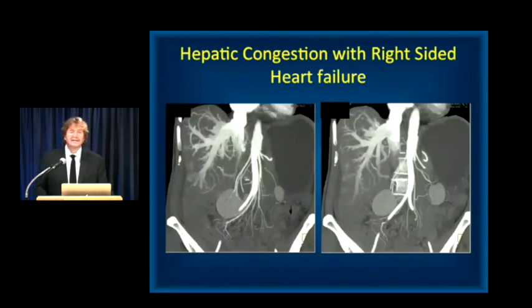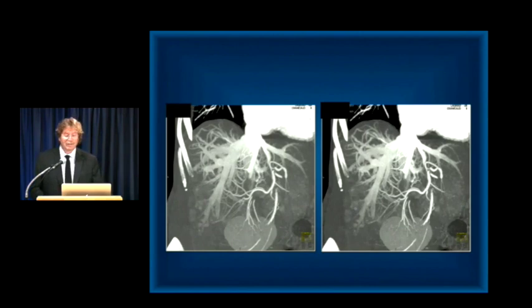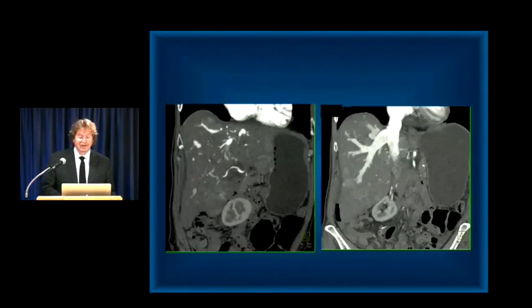And here's just one nice example. Look at the reflux into the IVC. Look at the reflux into the patient's hepatic veins. Very nicely shown there and on the MIP imaging as well. When you see this kind of reflux, well, you can kind of see the heart at the top of the image. The heart is definitely enlarged. So you need to be very, very careful.